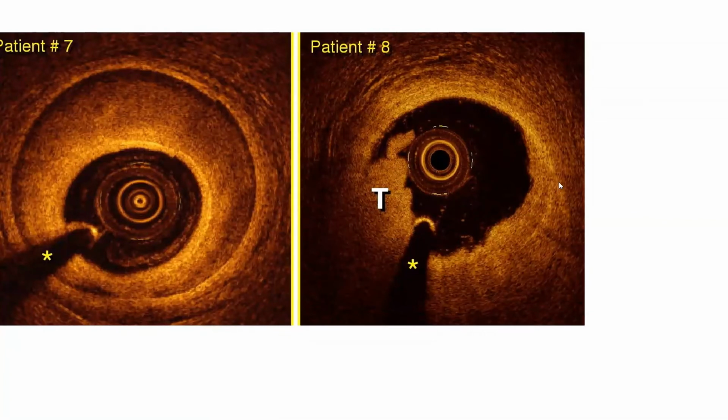And in fact, what this is, is intramural hematoma, that crescentic area, with a thrombus formation on top of it, okay? And that explains why with SCAD we use some degree of antiplatelet therapy. We definitely use aspirin. Plavix is controversial, but probably Plavix for a month is commonly used, according to most investigations I looked at, without clear-cut data, but most registries have used Plavix for at least a month. Okay.